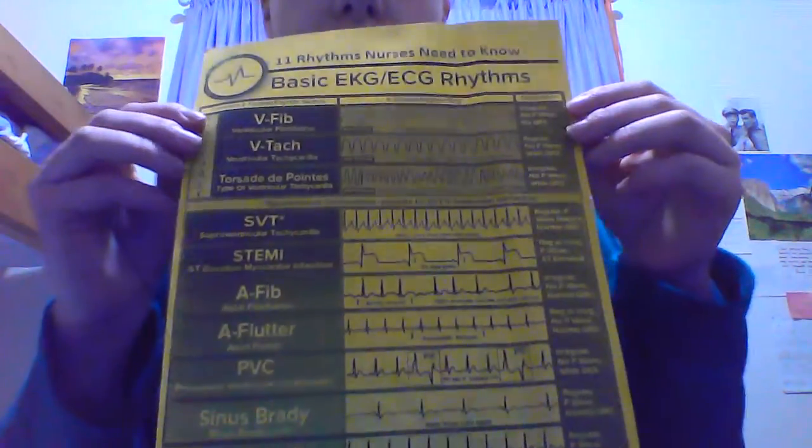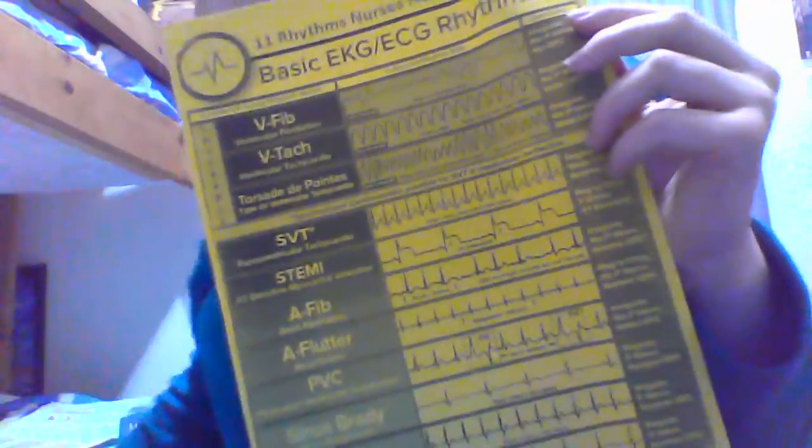If you can find a chart like this, maybe on Google Images or Pinterest, then print it out and look at it. Look at the rhythm analysis strips here. They have all these really good examples to go through. And then she also walks through the method for how you're supposed to read the strips to make the most sense. I think that's pretty helpful.